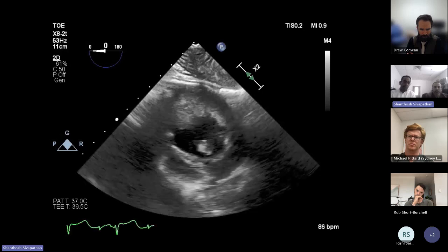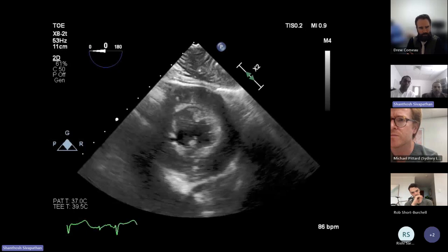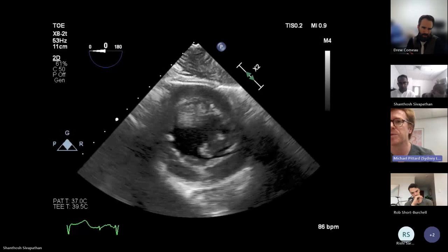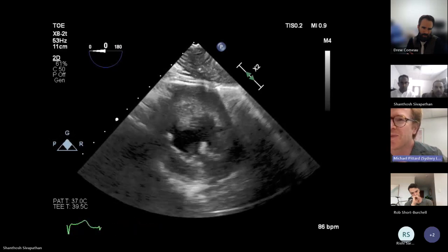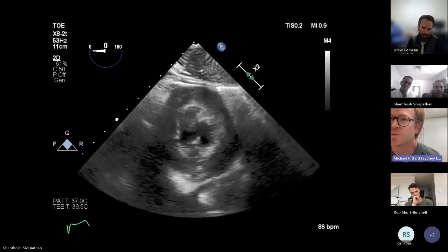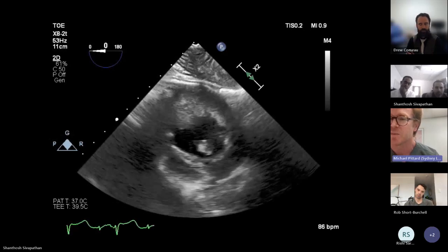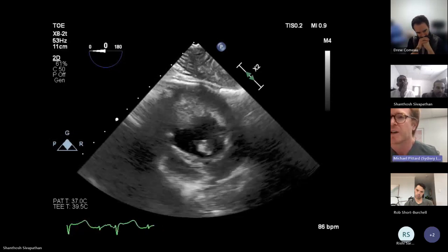Michael, continuing on, since you're doing this case, same patient still. This is post surgery. It's a TOE image again, a gastric short axis view at the papillary muscle level. Next to the posteromedial papillary muscle, there's another mass. It's really difficult to see what it is. The LV function looks reasonable to me, but there is regional wall motion abnormality adjacent to that mass, and I suspect it could be something like an LV thrombus. I'd be suspicious for it. I wonder if that's what we're looking at.